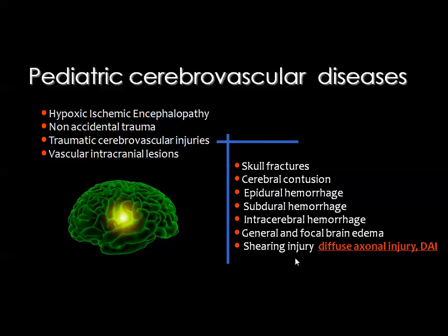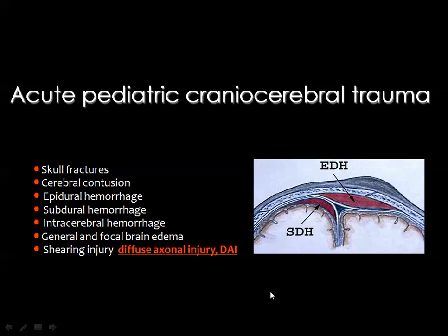And actually the vascular lesions we have discussed in the topic of intracranial vascular lesions presented in the series for adults. Then we'll give a short account about these lesions in the pediatric age group. These are the issues we would like to discuss, and this is a diagram which is very helpful so that you can appreciate the difference between the epidural blood and the subdural blood.